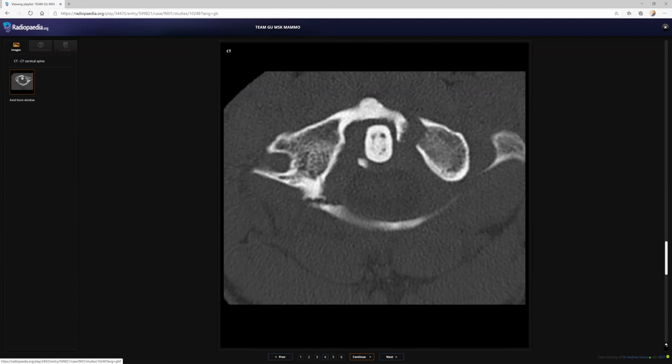Since it is a ring vertebra, if one arch fractures, then there is a fracture on the other side, like in a pelvic fracture, where there are ring fractures. So this is an acute emergency. In these images, I cannot see proper impingement on the cord. So the clinical history is important, and then further referral to neurosurgery for further assessment, immobilization and treatment.